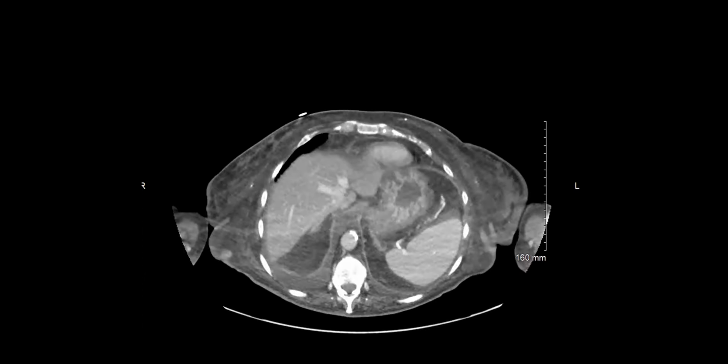Good for her. I have a quick question about this. How many months or years after the breast augmentation was this imaging? She presented with this 8 years after. 8 years. And she had been noticing that lump enlarging gradually in size. I'm not sure because I didn't see the patient myself, but she could definitely palpate it as a hard lump by the time it was this size.